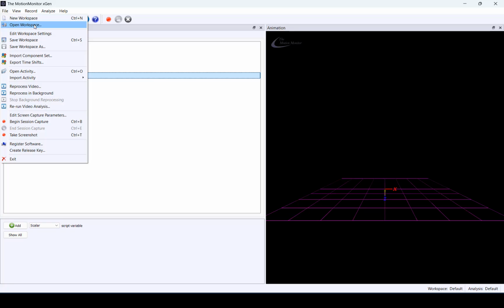You have a couple options for saving workspaces: Save Workspace and Save Workspace As. Clicking Save Workspace will save a workspace called Current. This is the workspace that will open in the Live window when opening the software and is saved anytime you close the software or after completion of a subject setup. Clicking Save Workspace As will prompt you to save a named workspace.